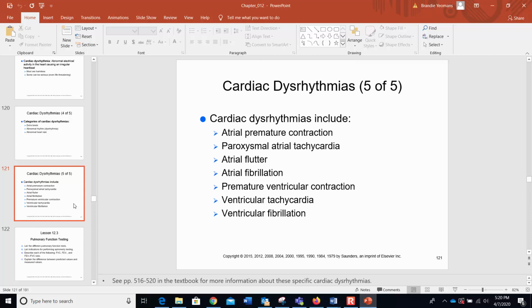Now, this could be sustained ventricular tachycardia. It is a life-threatening dysrhythmia because the rapid ventricular rate is going to prevent the heart from filling properly. So this is going to affect the cardiac output, meaning the blood flow as well, and it often makes this one thing happen, and it's really, really important. If you see V-Tach, most often it's always going to lead to V-Fib, which is ventricular fibrillation. Okay, and we don't want to see that one.